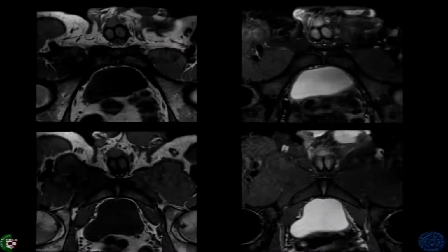You get a lengthening of the symphysis pubis, and you can see quite nicely the pubic bodies with that irregularity and sclerosis of the old apophysis. And you've got the tissues that we were looking at, that junction of the capsule, the adductor longus and rectus abdominis sitting at the front with a bit of fluid in the joint.